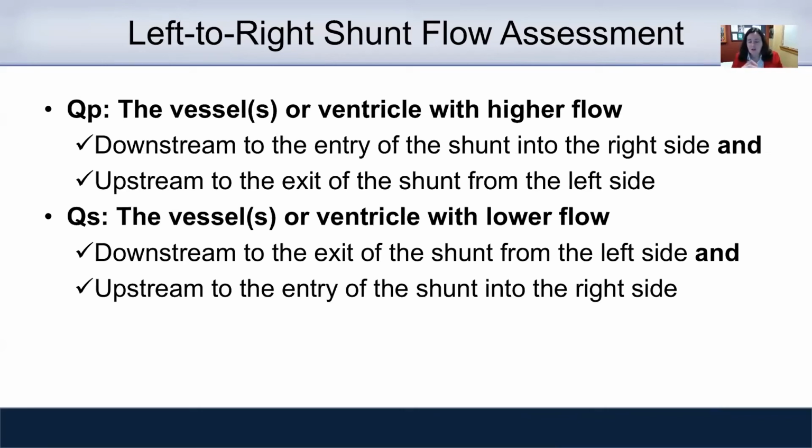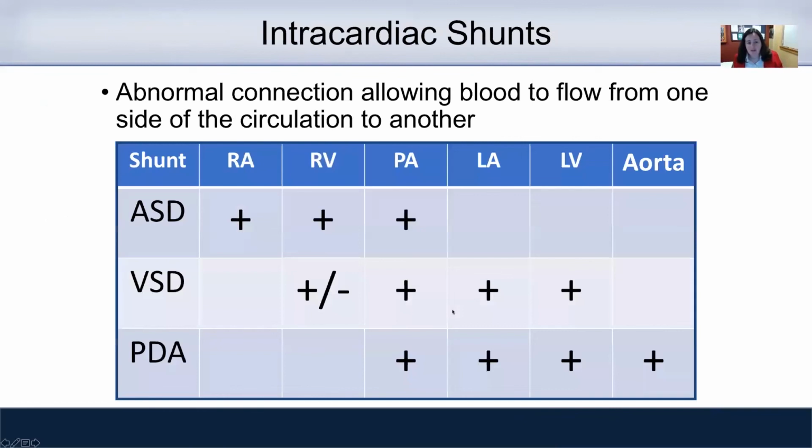Because you not only can use your aorta as a surrogate for the QS, but you may find other flow analysis helpful, such as adding in the superior vena cava to a descending aortic flow. That is also a commonly used source for QS.